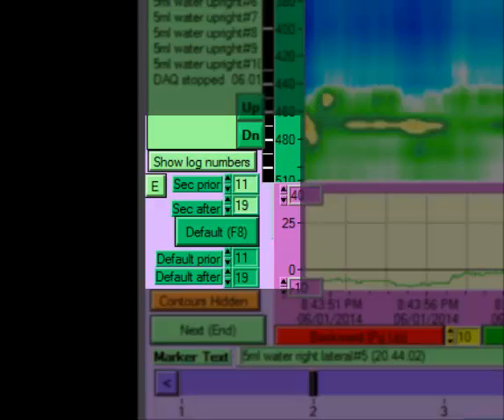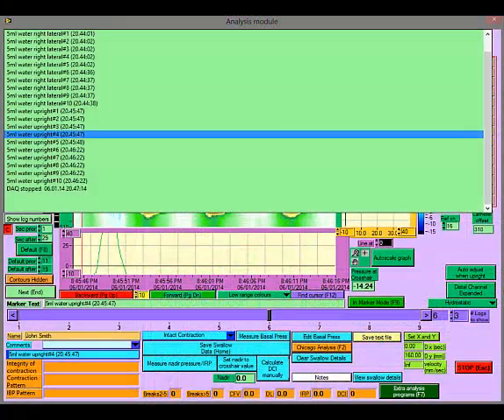If you cannot see sufficient text in the marker box, click on the E button to expand the text box. Alternatively, if you hover the mouse over the text for an individual marker, it will expand. Click on the C to return the expanded marker box to its normal size.